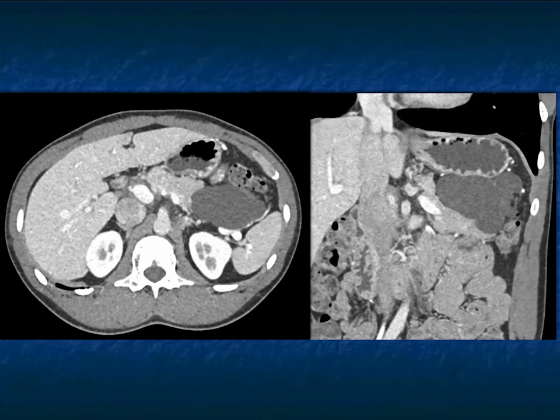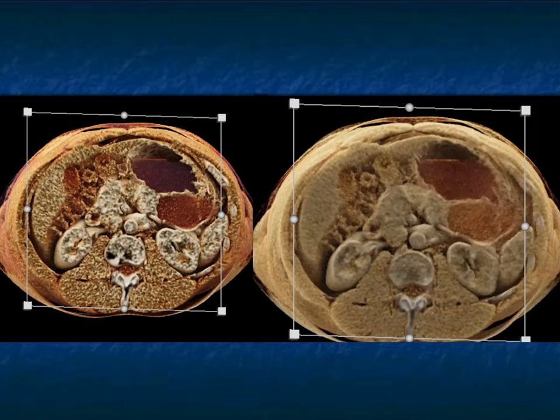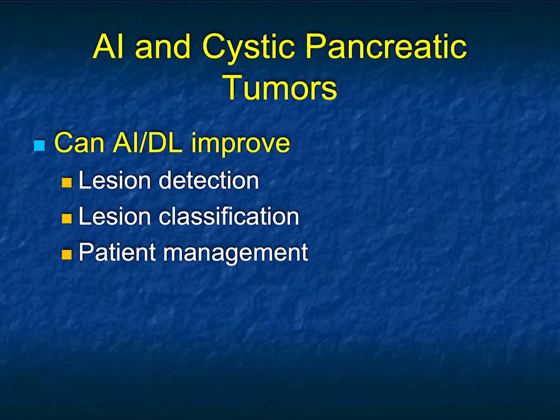But on the coronals, you can see it scalloping the gland right here. When I see scalloping, that's a lymphoepithelial cyst. Lymphangioma, mesenteric cyst are going to have mass effect, but the borders are going to be very, very smooth. And here's that same case with cinematic rendering.